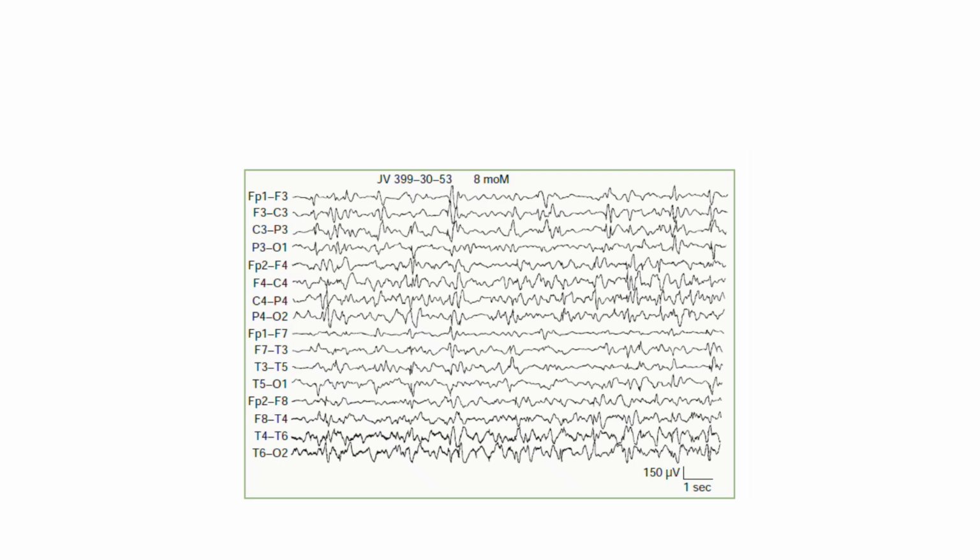Complete disorganization. There is no identifiable, normal background rhythm, such as a posterior dominant rhythm. The normal architecture of awake or asleep cortical activity is entirely replaced by a chaotic, random sea of waves. Multifocal spikes and sharp waves.